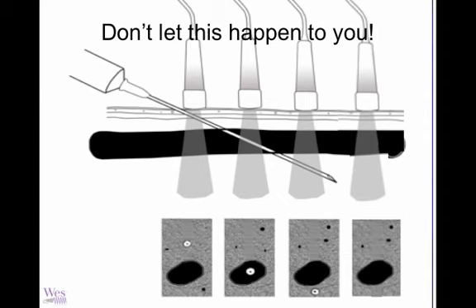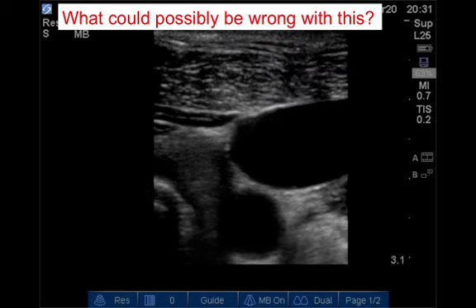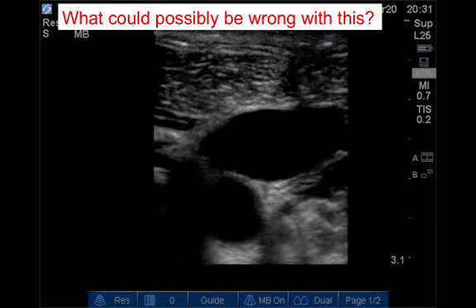Now, I'm going to prime you for something called the creep technique, which we'll come back to later, that is depicted here. And I want to allow you to think about the spatial and three-dimensional nature of ultrasound in the way that each ultrasound image here corresponds to the picture below, and how oddly each time the beam intersects with the metal, it looks the same, though the part of the needle that is being displayed is quite different. So that is the challenge of vascular access, and to do it at the highest possible level. More on this later.